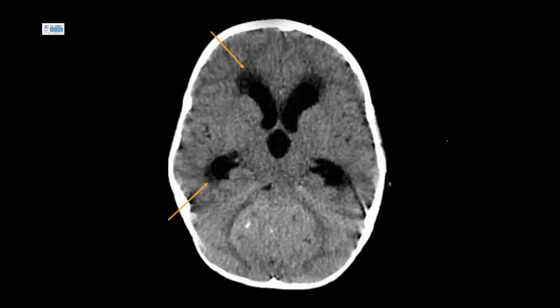So just to look at some pathology then. This is a non-contrast axial CT brain image. We can visualize a large mass located centrally within the posterior fossa. I don't know if you can appreciate, but it's slightly hyperdense on CT, and this points towards the possibility of it being a medulloblastoma. And this is a 6-year-old child.